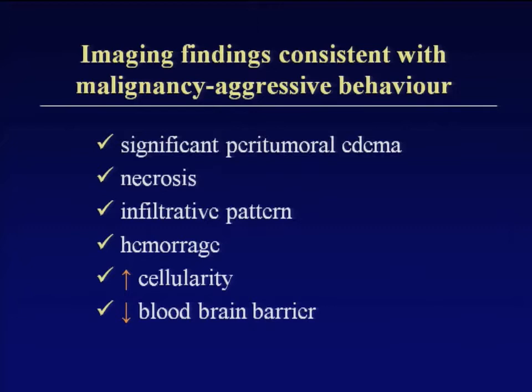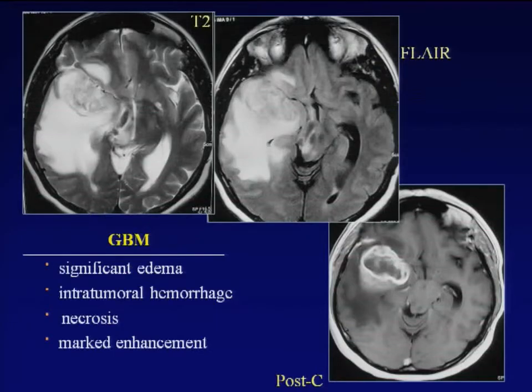And this is the typical image of a GBM. The tumor on T2 and FLAIR images, you see the abnormal enhancement and all this edema. And if we have to be correct, it's not edema when we are dealing with a primary tumor. All this area around is a combination of vasogenic edema along with infiltration of tumor cells.